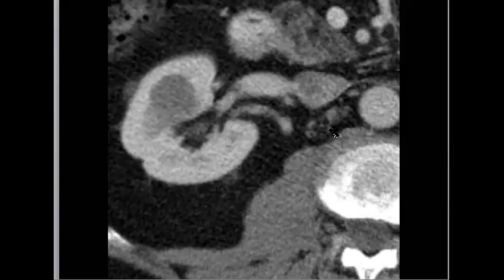So if you mention enhancement, then which stage are you going to, 3 or 4? 4, perfect, Ines. So if you mention enhancement, you are going to stage 4. If it is a non-enhancing solid component, you are going to 3, yes.